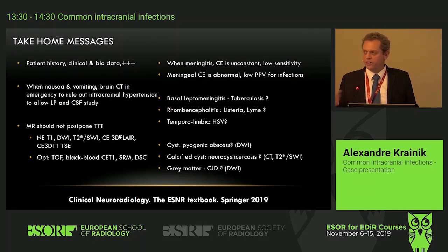Think of 3D post-contrast sequences and so on, to diagnose leptomeningitis or to be more sensitive to meningitis. When it's mainly located at the basal brain, you may think of tuberculosis. Remember the rhombencephalitis due to listeria or Lyme disease. When it's temporal, always think of HSV, herpes.